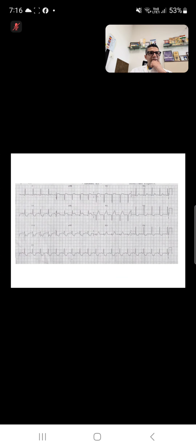Okay, we'll go to the next ECG. Anyone wants to comment on this ECG? Anyone can volunteer. We'll just help you out in reading the ECG. You can start off in the normal protocol which we mentioned.